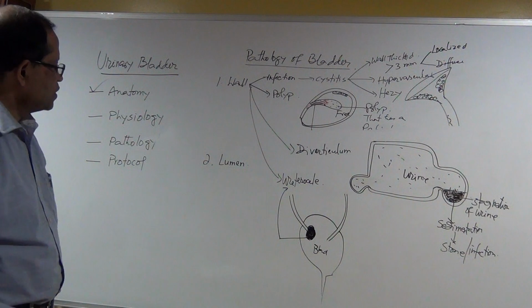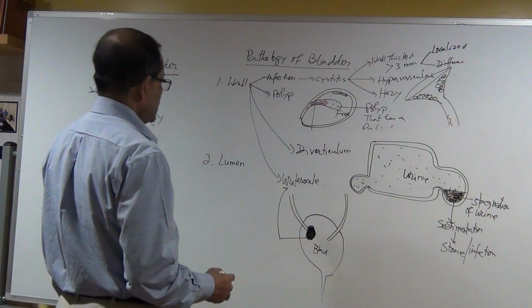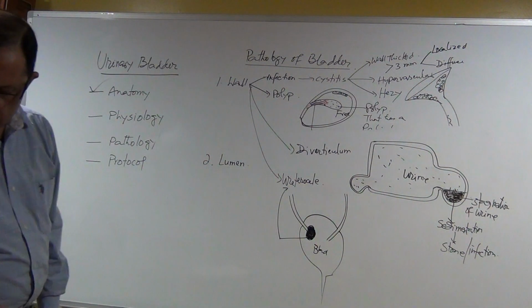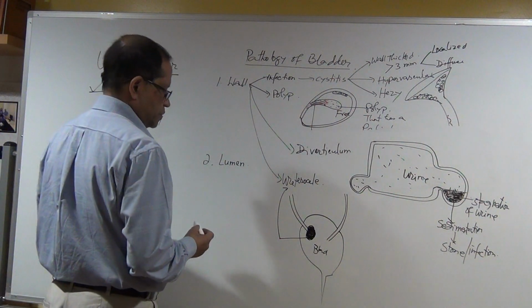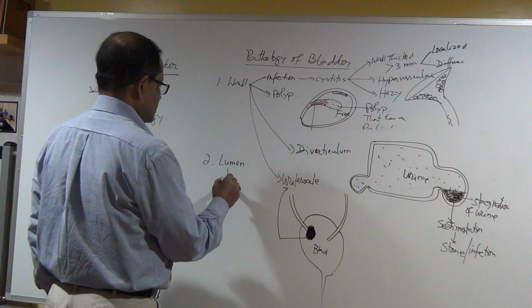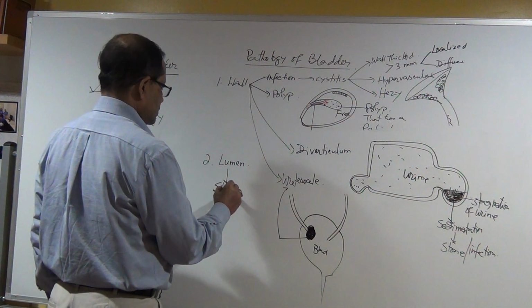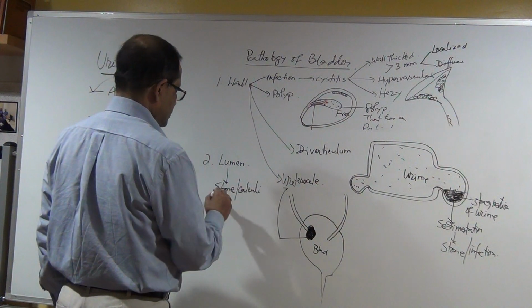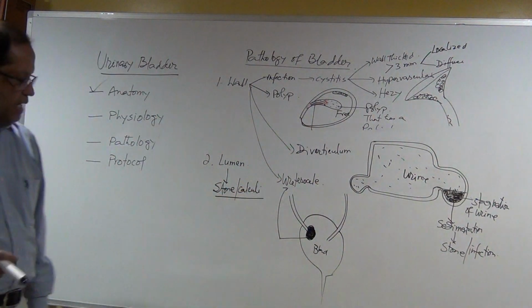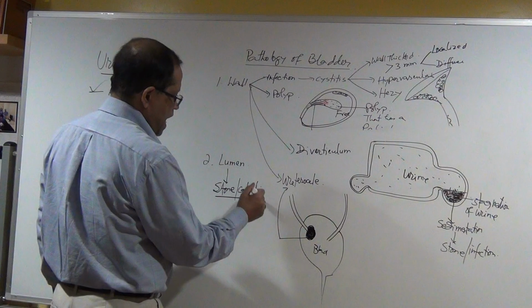Now I will discuss the stone. Stone in the bladder, or calculi. Keep that in mind: this stone and the calculi.